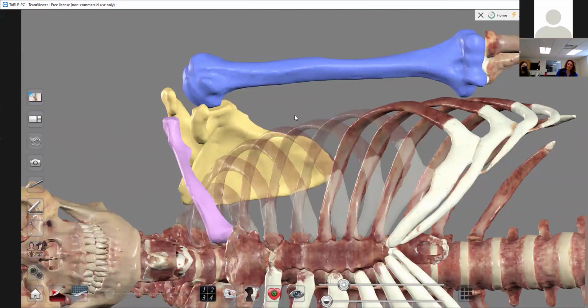So that is what flat coloring is for. A lot of instructors will use flat coloring just to point things out, like in this one, we're highlighting the three bones. But it can also be used in more of an assessment way, like what is the pink bone, what is the yellow bone, or sometimes activities will require students to do flat coloring themselves.